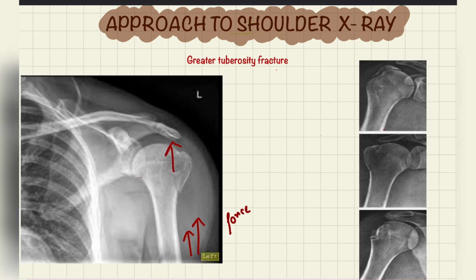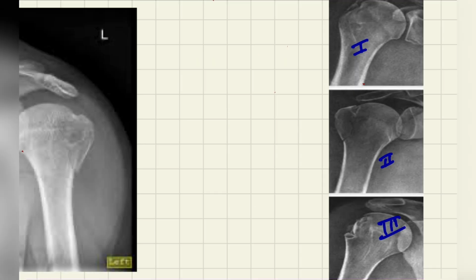So there is a strong force coming from the downside, and here the collision happens at this area, and this will cause the fracture.